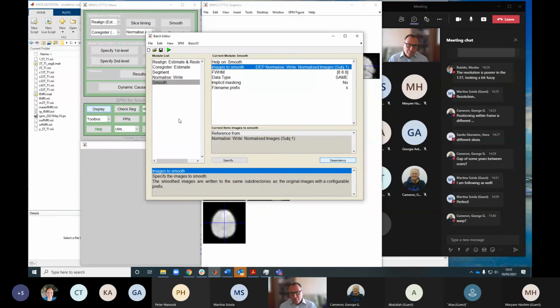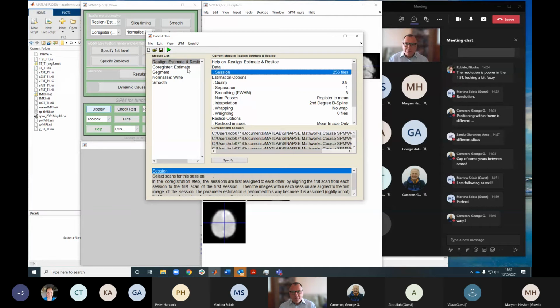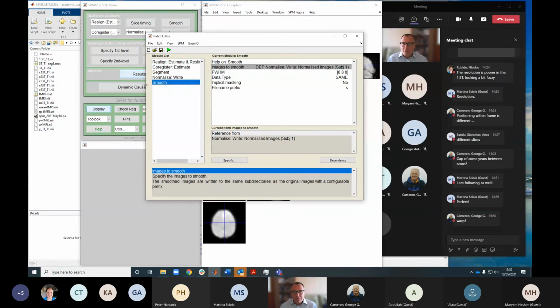And that, we have some data to enter there. We probably have some data to enter here for our T1. And then we will step through all these processes, go through the whole processing pathway, and then the output will be our smooth, normalized functional imaging data. That's good. That means we can do all of these steps one after the other for one single individual.